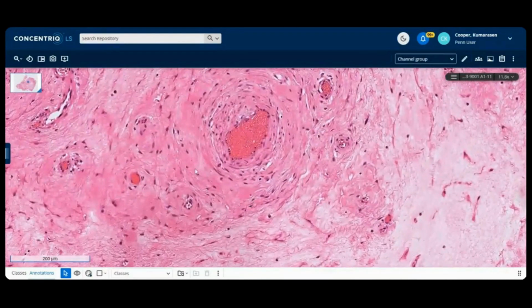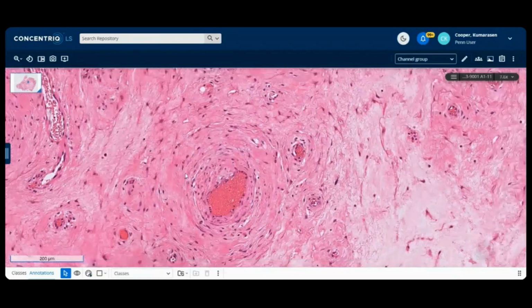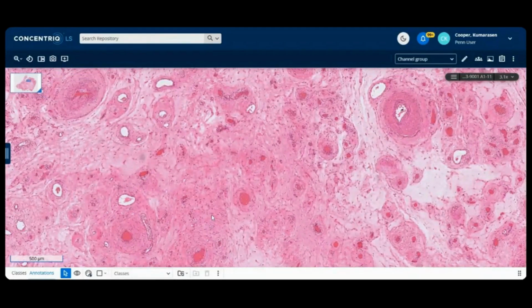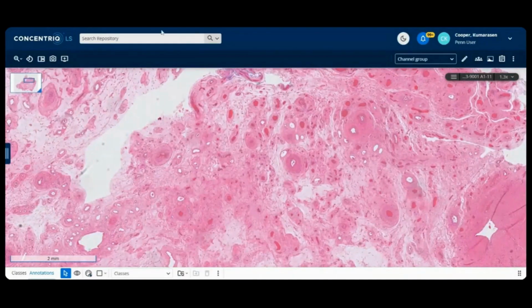Here, these characteristic epithelioid cells around vessels with desmin immunoreactivity is a very nice, useful feature, and I like that, along with the varied size of vasculature and, of course, ER positive. RB1 was intact in this because, as I said, this is not one of the RB1 lost tumors. All right. So nice, interesting, benign, bland-looking tumor.